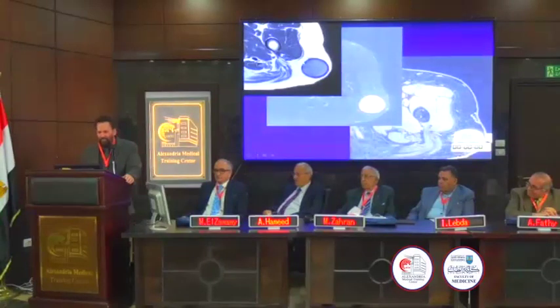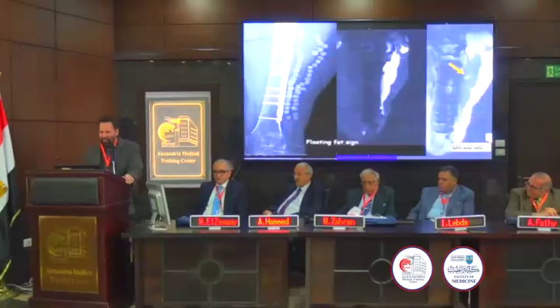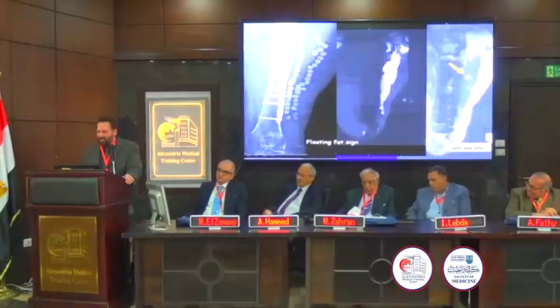So here are multiple muscle abscesses. Can you see the rim enhancement? A skin abscess, subcutaneous I should say. Patient had chronic osteomyelitis and a good subperiosteal abscess. Can you see the big subperiosteal abscess? Which they took out and put antibiotic impregnated beads.